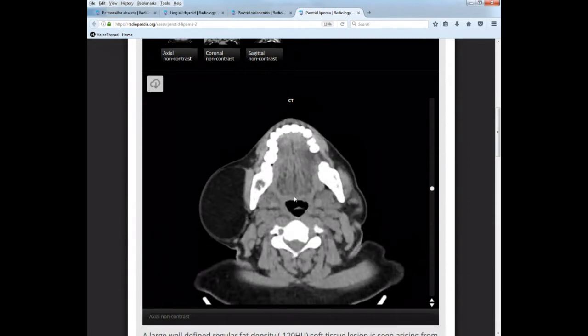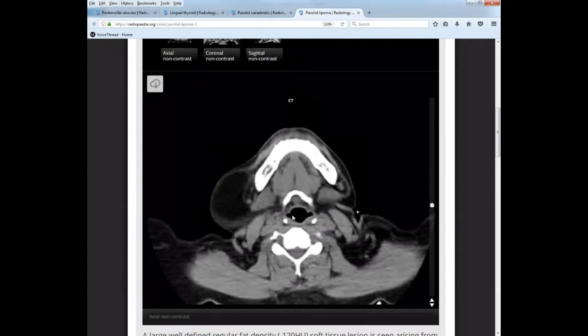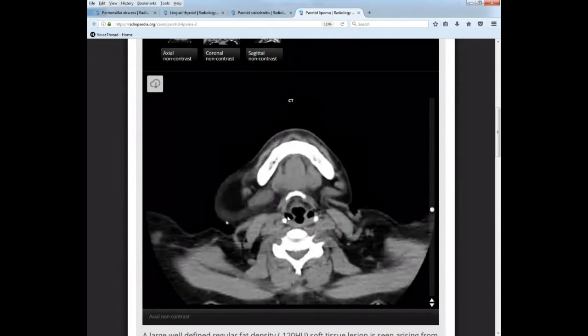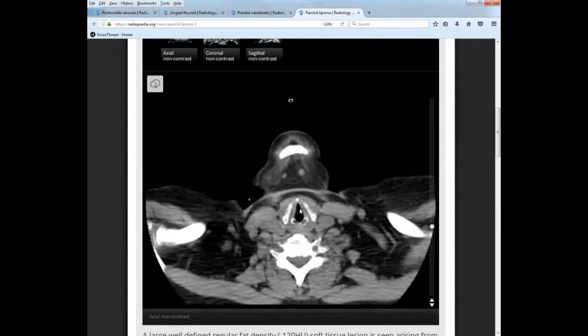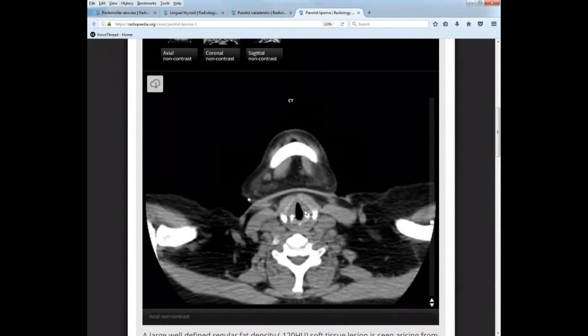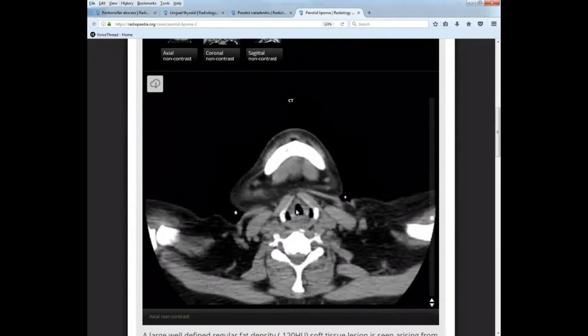So as we come down, we now want to look for epiglottis, which here's epiglottis coming in. So the pouches anterior to that are going to be your vallecula, and then the pouches posterior are going to be your piriform sinuses. Okay, and then as you go down, we now have the glottis, and the reason I know this is the glottis is because this is the opening when the vocal cords are in a relaxed position. All right, and this is a good study to look at the cartilages.